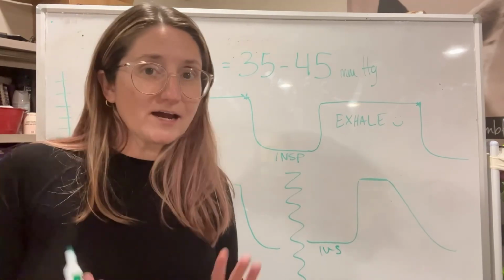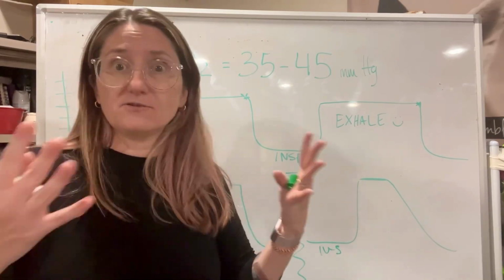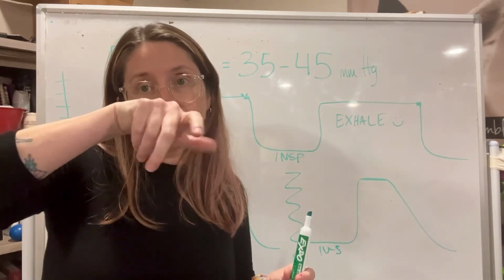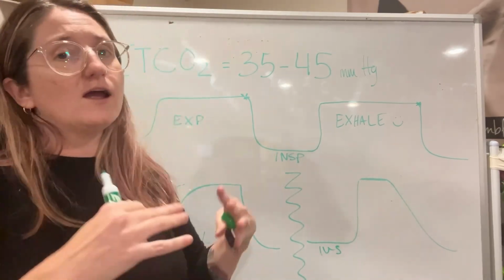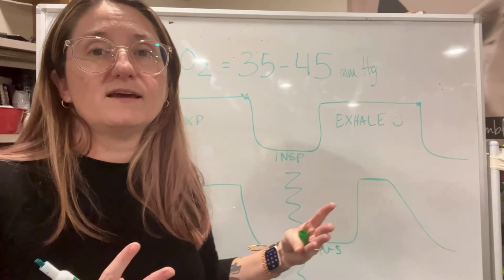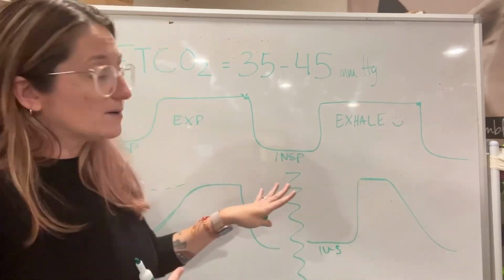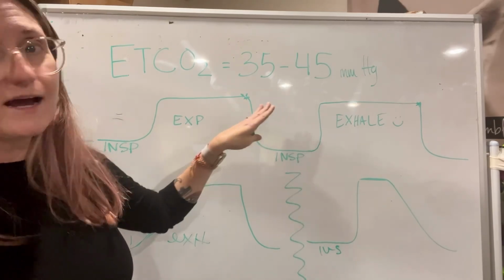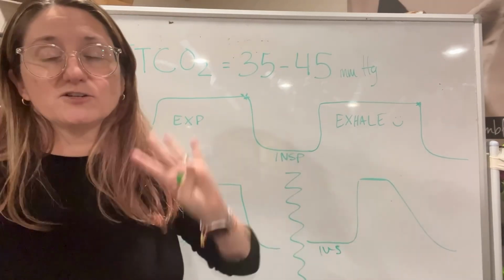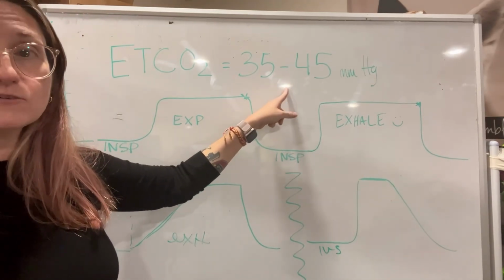So if your patient's cardiac output is really poor because they're super bradycardic, or they're super vasodilated because accidentally we have them on 4% of sevo, or they're hypovolemic, like that patient that came in a little bit shocky and we haven't fully fluid resuscitated them, remember, if our cardiac output is terrible, we're not going to be able to adequately deliver oxygen, pick up CO2 and get rid of it. So our CO2 numbers will start to decrease.